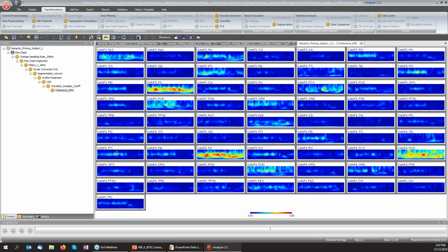This is plausible because volume conduction effects might be most strong between neighboring channels and lead also to widely distributed coherence. These effects are partially, but not completely discarded by the current source density, which we've applied before. In order to attenuate further the effects of volume conduction, we can apply the imaginary part of coherency.